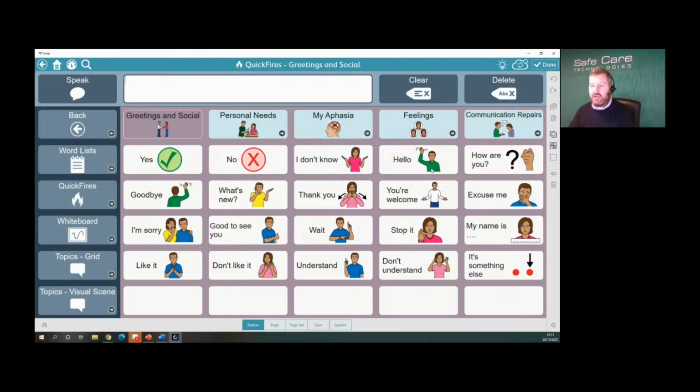These in context symbols are there to primarily help people with aphasia maybe understand a little bit more what the symbol means. You'll also find the text is on par. The label is on par to the left of the symbol, so that maybe there might be word recognition or symbol recognition. So they're both given equal importance on the button.